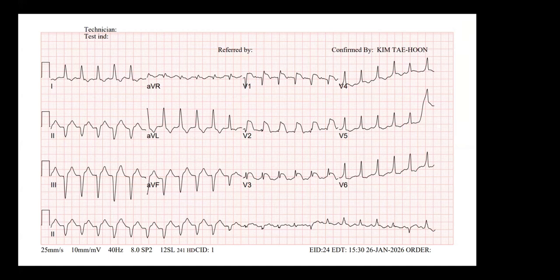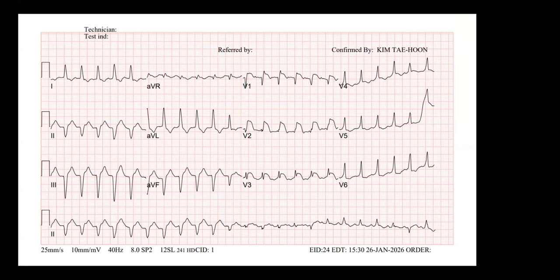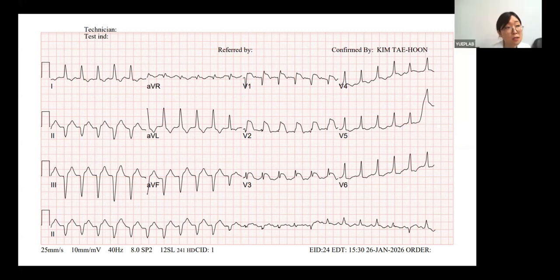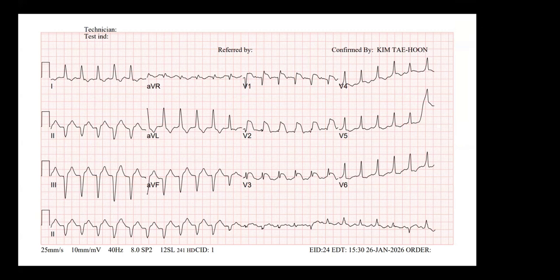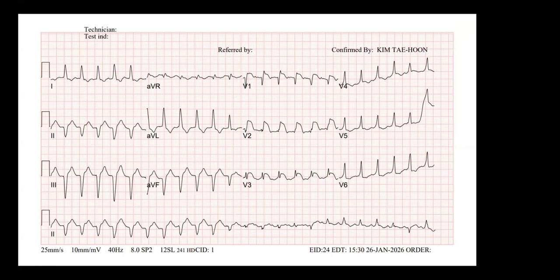I can hear you. This patient is actually the malignant melanoma patient, am I right? Thymoma. Okay. And the oncologist used the immune checkpoint inhibitor, and afterward he had a severe autoimmune reaction, and his ECG changed abruptly. I think it copied really well, the ECG there.